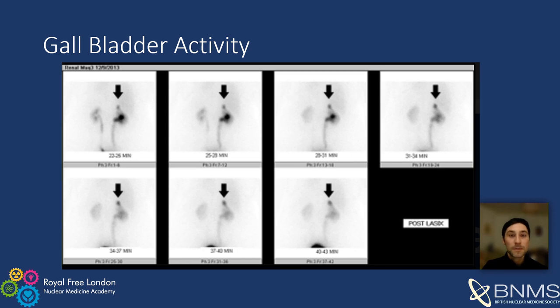Finally, sometimes activity in the gallbladder has been mistaken for renal activity, and delayed images may show bowel accumulation. A small fraction of the administered dose of MAG3 is transported to the gut via the hepatobiliary system. This fraction increases in patients with impaired renal function. Any regions of interest should exclude this.